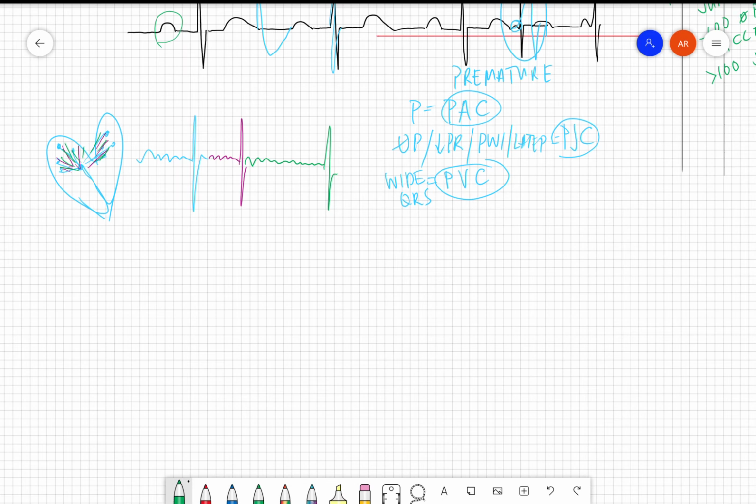This is what we would call, wait for it, atrial. Wait for it. It's coming from the atria, right? The atria is the one that's causing this problem. Atrial fibrillation. And we know that as AFib. That's what AFib looks like.